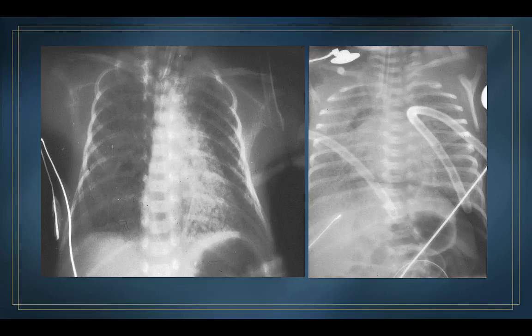If you do a decubitus film in a baby with a pneumoperitoneum and a posterior pneumomediastinum, and you demonstrate an intraperitoneal fluid level, not intraluminal, but intraperitoneal, it has to be a perforated viscus, because a pneumoperitoneum that's from dissection of a pneumomediastinum should never give you an intraperitoneal fluid level. There should be no bleeding associated with that.